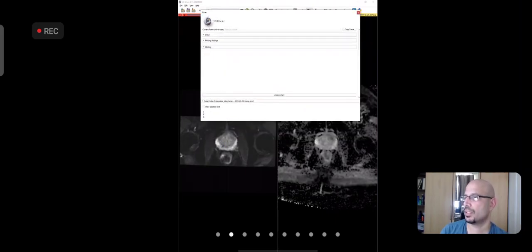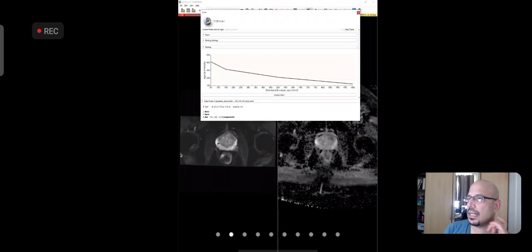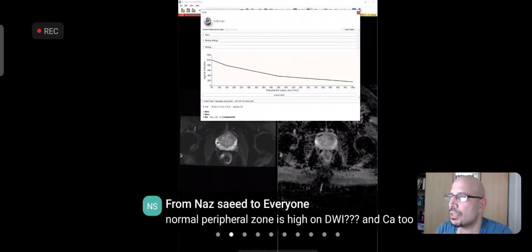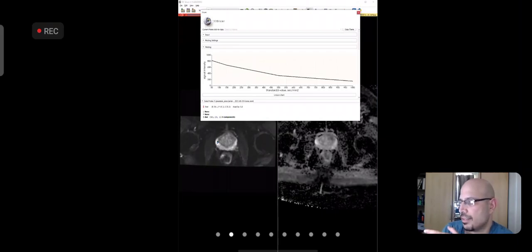अब ये पूरा slope बता रहा है कि left पे low B value है और right side पे अगर आप जाएं तो high B value. 1000 तक जा रहा है. I think हमारे scanner की 1400 तक थी. So I don't know, maybe it's cropping the high, or maybe it is a 1000 or whatever. Probably it's B50 on the left. Probably the first image is B50, and I suspect maybe in that case, last is 1000.